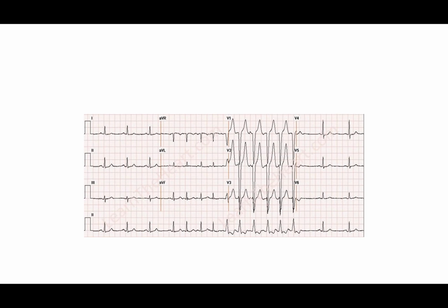All right, so this is going to be our last. Yeah, this one's a little tricky. This will be our last left bundle here. So we've got pretty much P waves, right? Kind of a normal sinus thing going on. It starts to get a little irregular here, though, right? But it's not going back to the regularity over here. It's just speeding up. From here to here the rate is speeding up, and this is its new regularity.